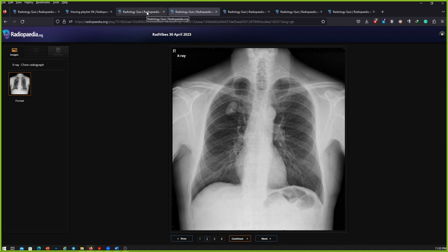Okay, have a look at this one, please. Okay. I have been provided with an X-ray chest, and I can see that there is a well-defined opacity in the right upper lung lobe. The rest of the bilateral lungs are unremarkable.